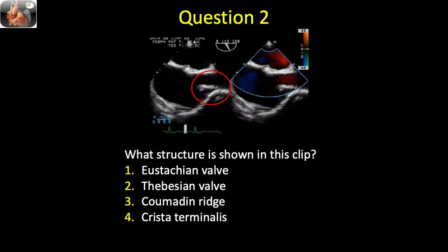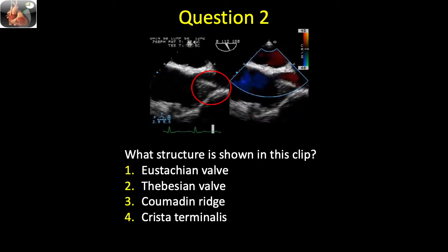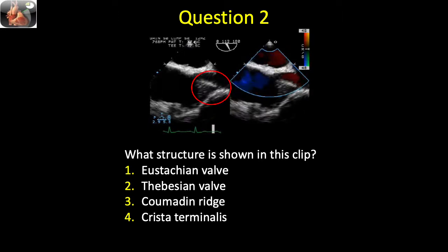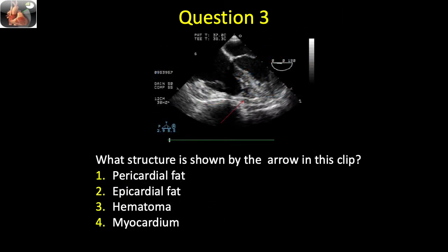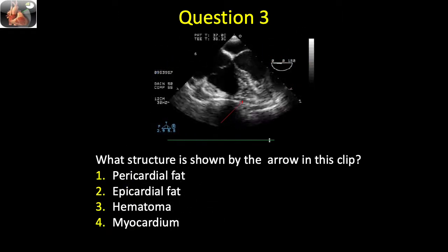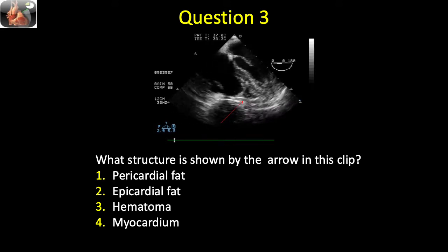Question 2. What structure is shown in this clip? Question 3. What structure is shown by the arrow in this clip?